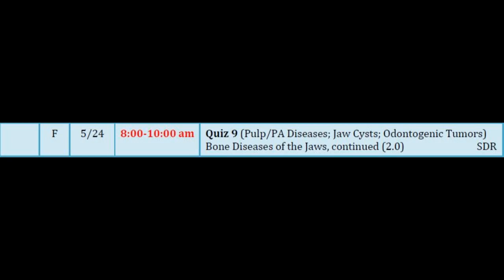This is a patient with polyostotic disease that's affecting both sides of the maxilla and the mandible. The mandible doesn't look as enlarged, but you can see with his radiograph kind of a cotton wool pattern, that clumpy increased opacity. Definitely not a ground glass pattern change. So he has some interesting changes. A lot of decay. I'm not sure why. Maybe he is discouraged and gave up on his teeth.